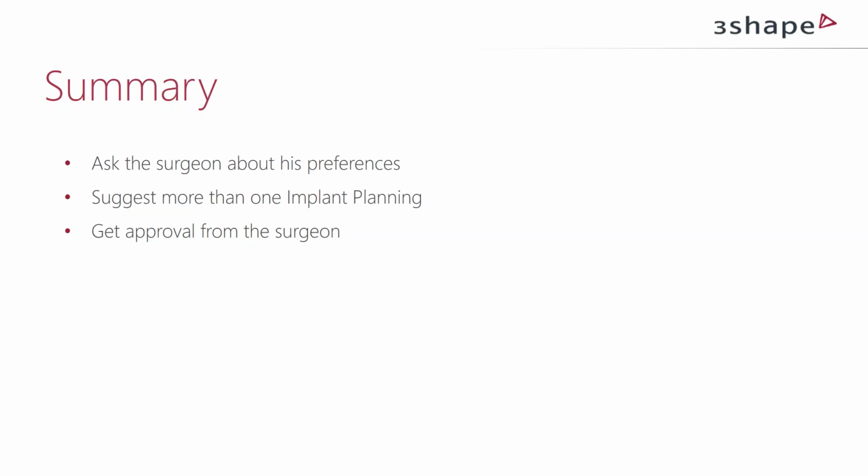So if you have a case in Implant Studio that includes a CT scan and you send it via 3Shape Communicate, then the receiving end will not receive the CT scan, but he can receive the entire case, and he can manually then go in and load the CT scan if it's transferred to him somehow else. This is something we're working on to of course support full case transfer of this via Communicate, but it's not available yet.